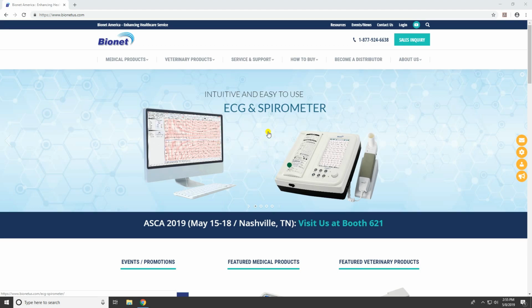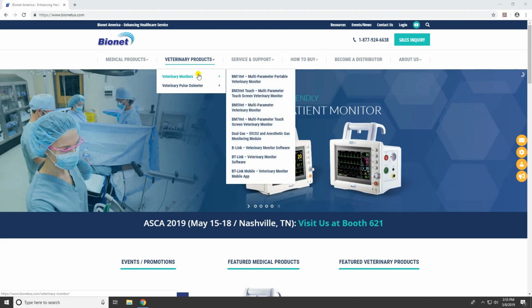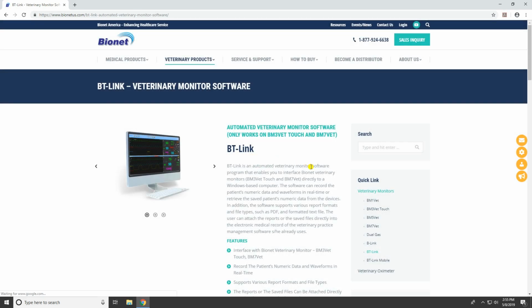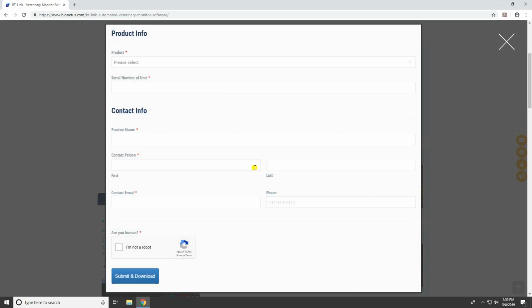Log on to bionetus.com. Hover over Veterinary Products. Hover over Veterinary Monitors. Then select BT-Link Veterinary Software from the menu. Once this page loads, click the Download button at the bottom of the product summary.